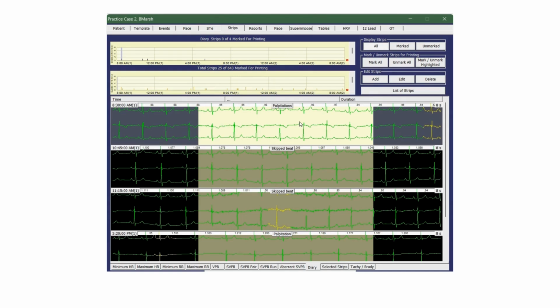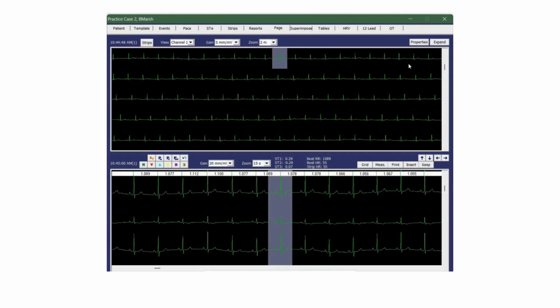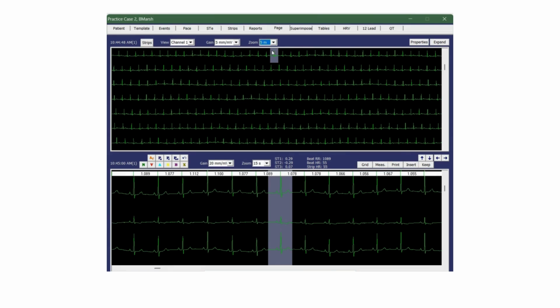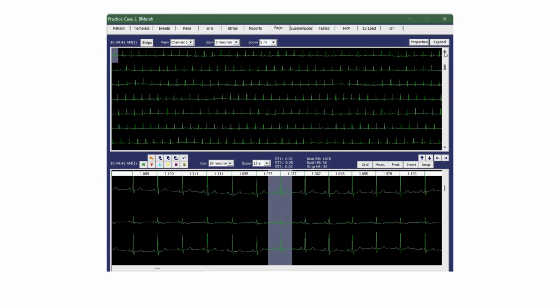Anything that is listed, even if it's just eating lunch, we want to make sure that you actually take a look around the time frame. So here, 10:45. I can zoom out here as well, so it could zoom back. This is 10:45. If I click down here, we're at 10:49. So there's about 5 minutes away. And again, we'll check 5 minutes before.